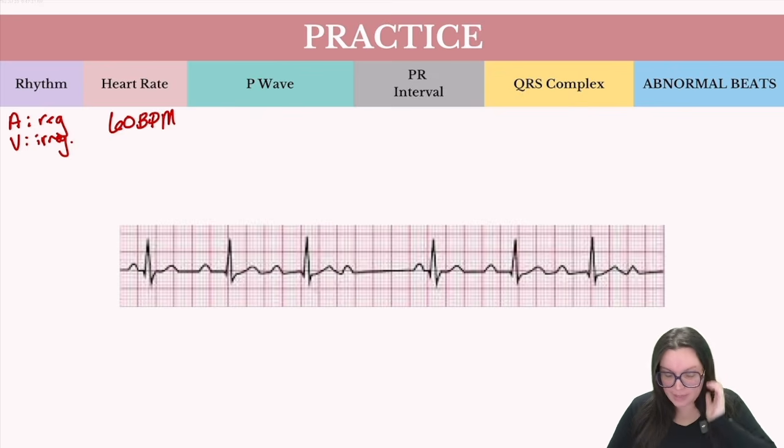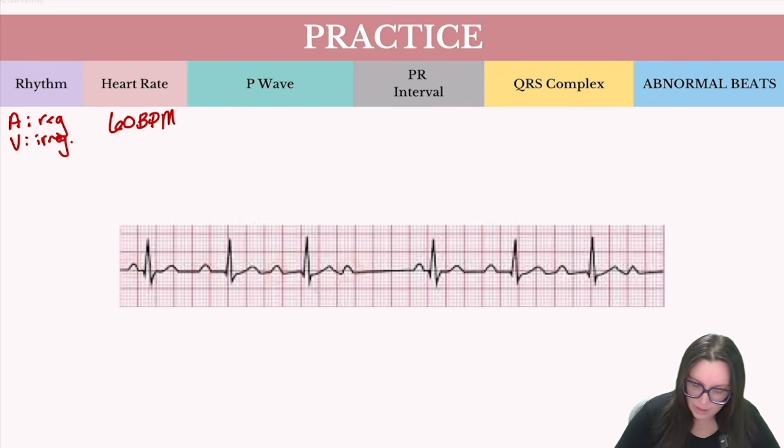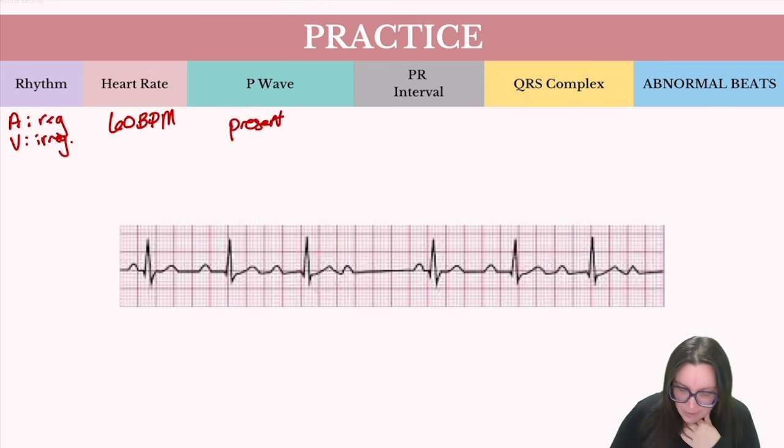Do I have P waves? I absolutely do. I have a P wave here, P wave here, P wave here, P wave here. So they are present in this situation. But when I'm looking at my PR interval, I'm noticing some kind of pattern here.